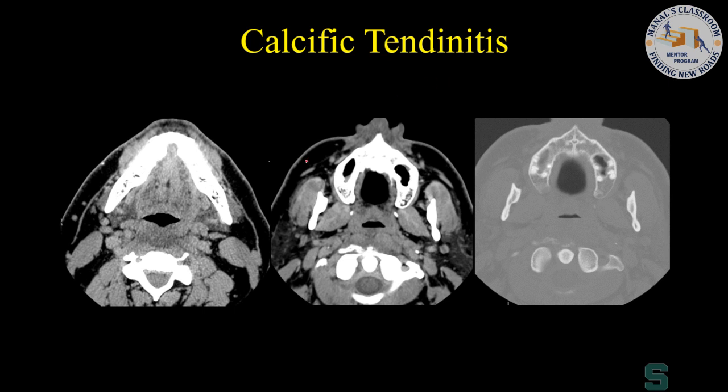Does anyone see the calcific tendinitis here? Someone explain to me the abnormality. Is this normal or abnormal? Why? Edema. Perfect. Normal or abnormal?